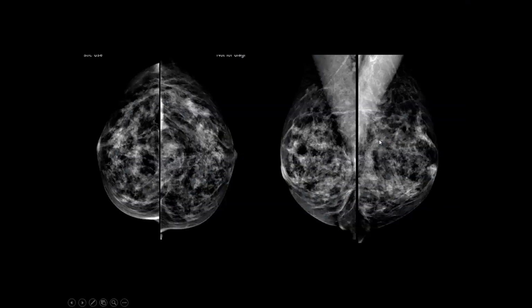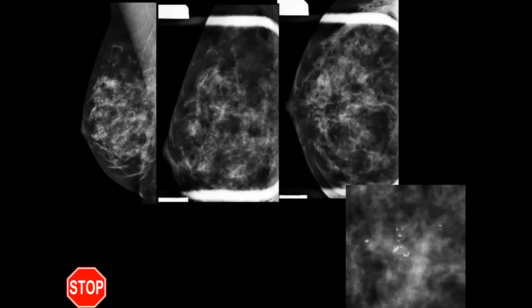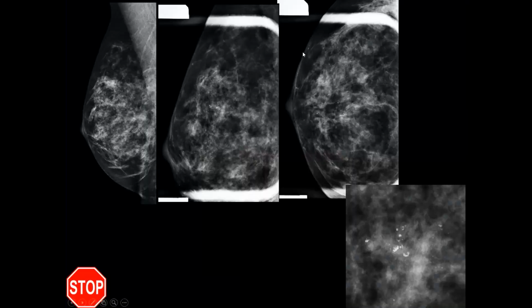Case number 10, history is screening. Okay, and now, because calc cases are always notoriously hard on projections on PowerPoint, I've provided you with some additional images. And to be extra kind, a few extra images. So now I'll go to the question, and I'll scroll back so that once the question pops up, you can continue to look. Hold on, sorry. There you guys go.